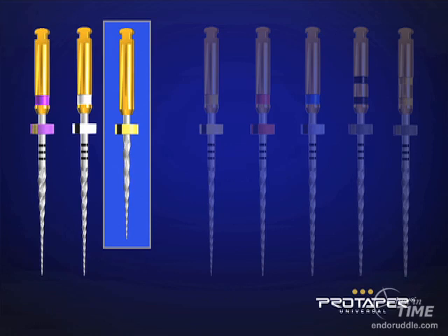At D6, D7, D8, and D9 of Shaper X, you have a GG equivalent of a GG1, 2, 3, and 4. This means that D6, the cross-sectional diameter is equivalent to 5/10 of a millimeter. At D7, it's 7/10 of a millimeter, D8 is 9/10 of a millimeter, and D9 would be 1.1 millimeters. This means at D9, 1.1 millimeters, you have the same cross-sectional diameter as the purple and white are at D16, which are about 1.1 millimeters.